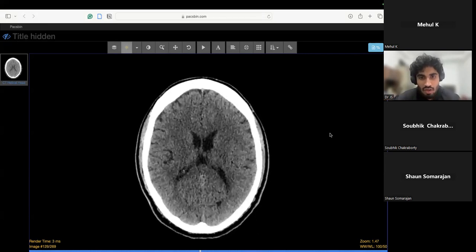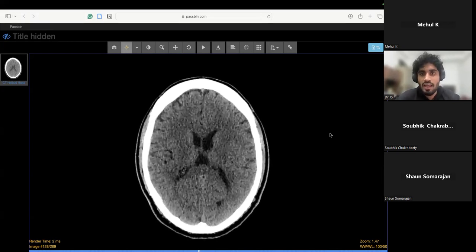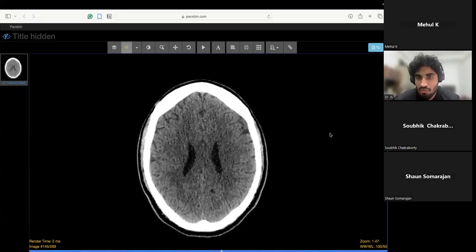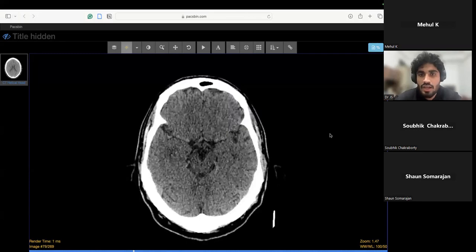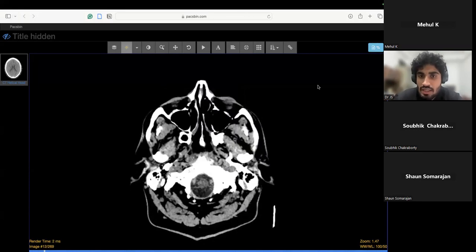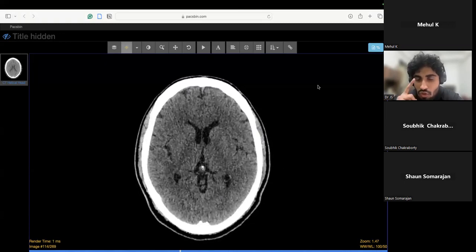And when we identify the patient, when we look at the CT scan, we won't be easily appreciating details of this. So practice is also required, and there are some free sources available. Looking through these packs and other things, I will be later on discussing that. So the skill part is the scrolling, and also making sure to focus on one aspect of it, and our peripheral vision should see the other things.